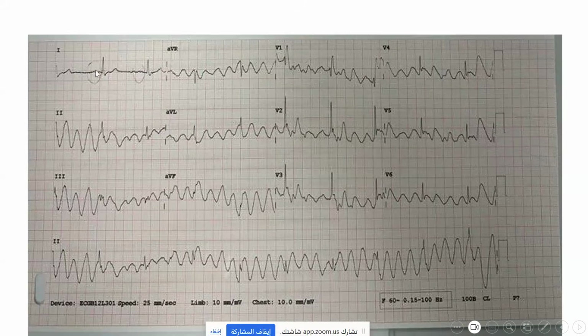You have a P wave, QRS complex, P wave, QRS complex, right? Yes, right. Now look at the other leads. The ECG is done all at once, simultaneous printing, so all of the recordings are simultaneous. It can't be sinus in lead 1 and VT or polymorphic VT in lead 2, or whatever, right? Yes. So this is likely artifact.